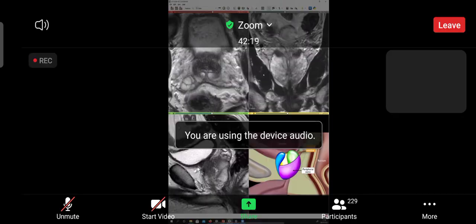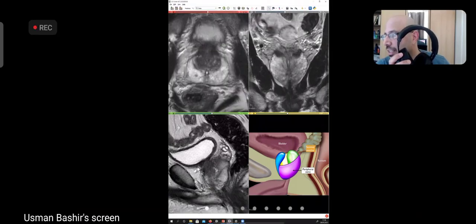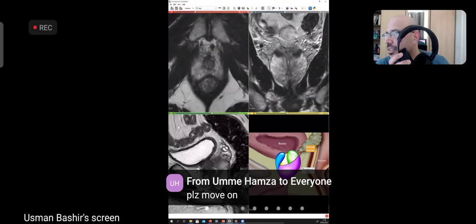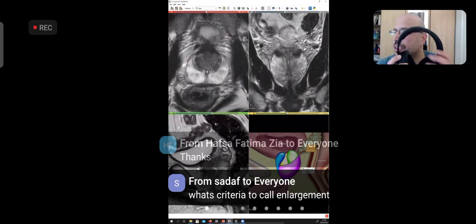He also has cancer actually, but I don't want to confuse you guys too much. This black dot is cancer. This is a second dot here, this is also cancer. But if you ignore the cancer, it's a very good example to teach anatomy.